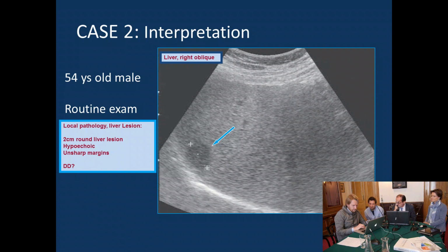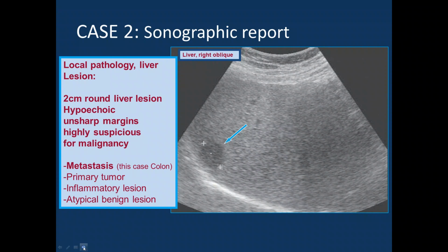And always, if you are in a differential diagnosis of a tumor, you can mention lymphoma, because this is at last a tumor able of producing almost every kind of morphology, as well as in inflammation is tuberculosis. These are the two tricky diseases. Okay, so I think that much was said about this lesion, and it is indeed a metastasis.